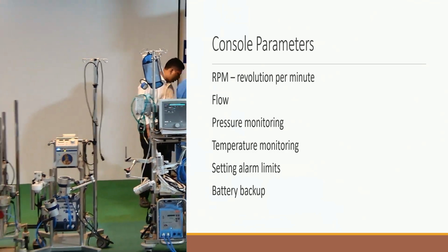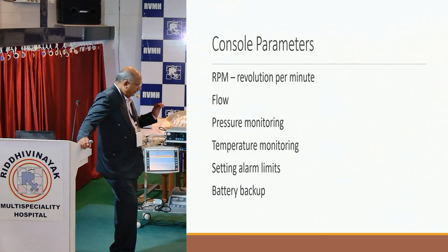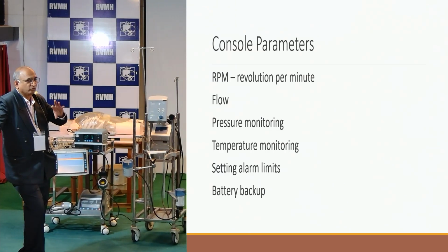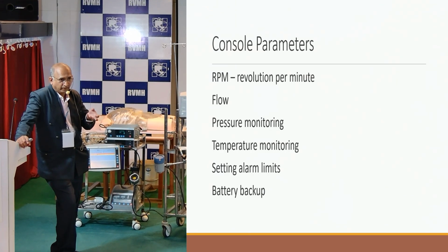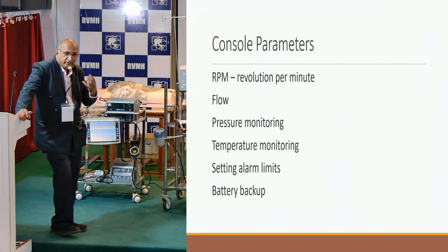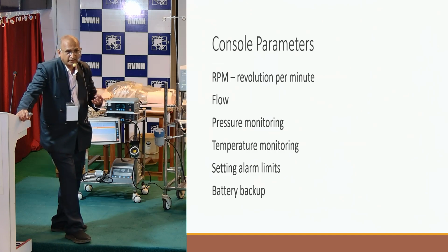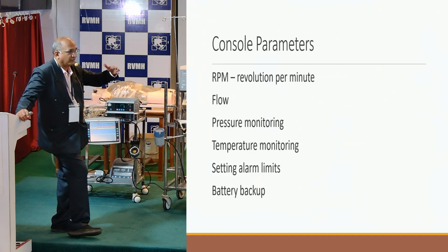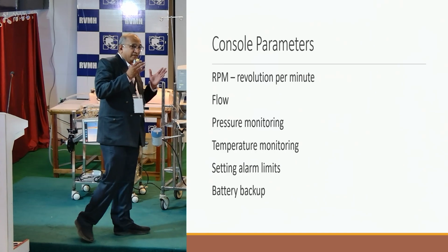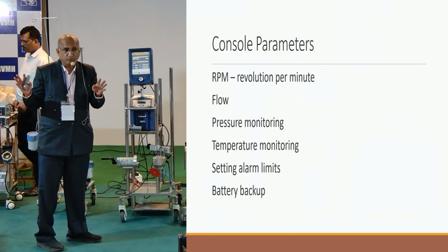Okay. Now, again, if you see the size of this external motor drive and the size of the pump, it varies in all these machines. And as the pump becomes smaller in size, the RPM requirement will be more. Again, I'll be discussing this when I discuss the centrifugal pump per se. But your RPM and flow ratio will be different for different machines. There's no standardized RPM and flow ratio.